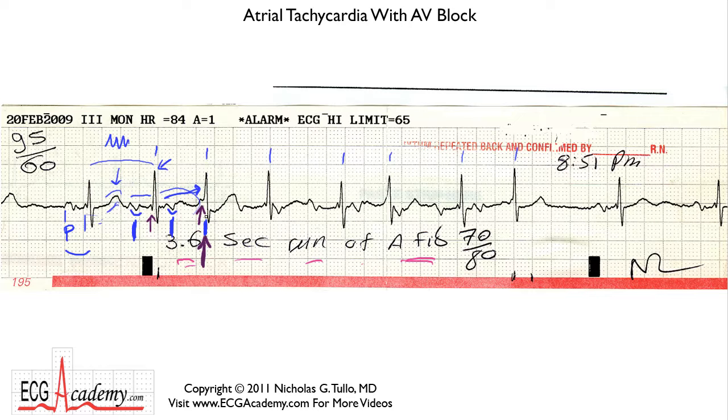Now, if that's the next P wave, where's the QRS complex that follows it? There doesn't appear to be any. Well, let's keep looking at the P waves. Do they map out? Well, if you look another 400 milliseconds out, you see this signal, and then you see this signal, and then you see this one. You have to use your eyes and try to pick these signals out. And here's the next one, and the next one. And so what's happening is that you have this atrial tachycardia that's proceeding through the strip at a rate of about 150 beats per minute.